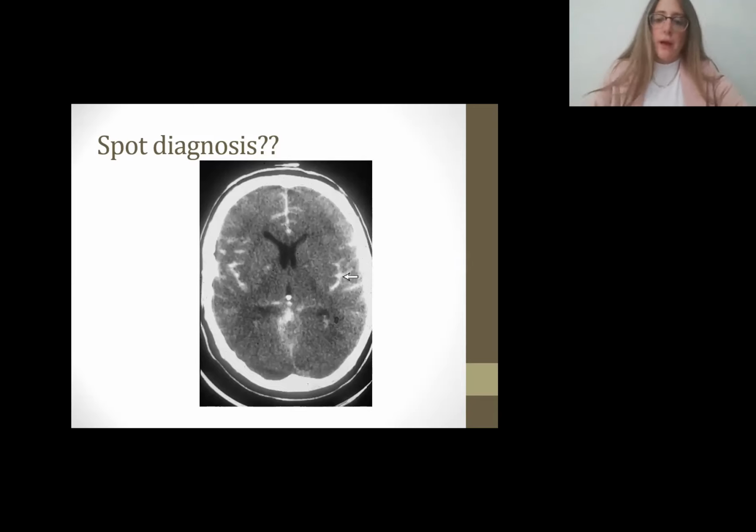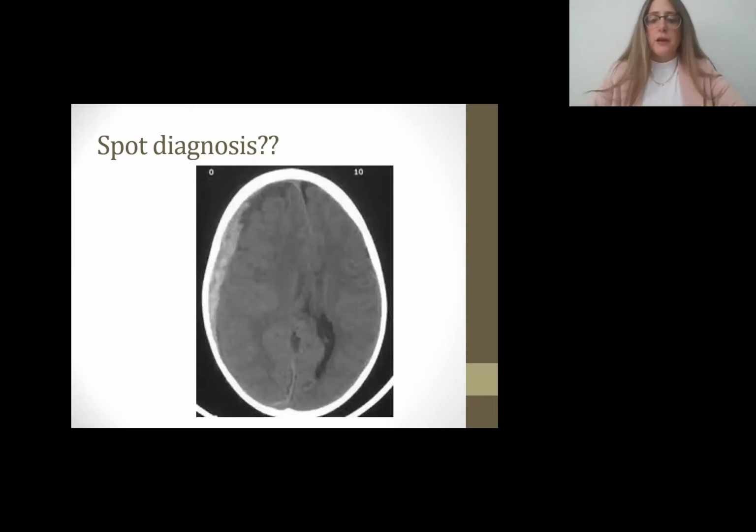So this is subarachnoid. And here it looks like crescent, moon-shaped. This gives me, as I said, Ramadan vibes. This is most likely a subdural hematoma. Always think, by the way, don't miss out shaken baby syndrome, because let's not forget, most of our exams are incorporating a lot of aspects together, especially pediatrics. And shaken baby syndrome, if you can tell here, there's the acute one and there's a little bit of an element of a chronic one.